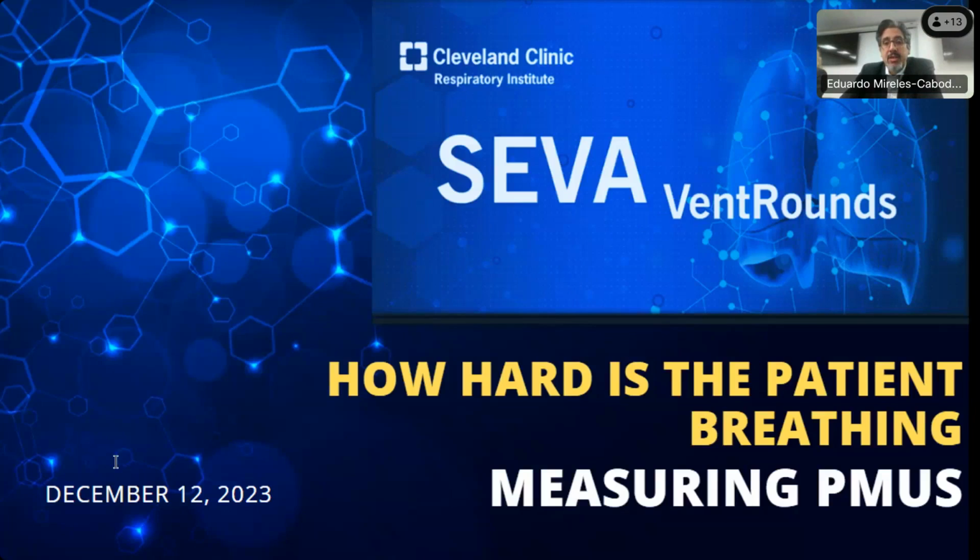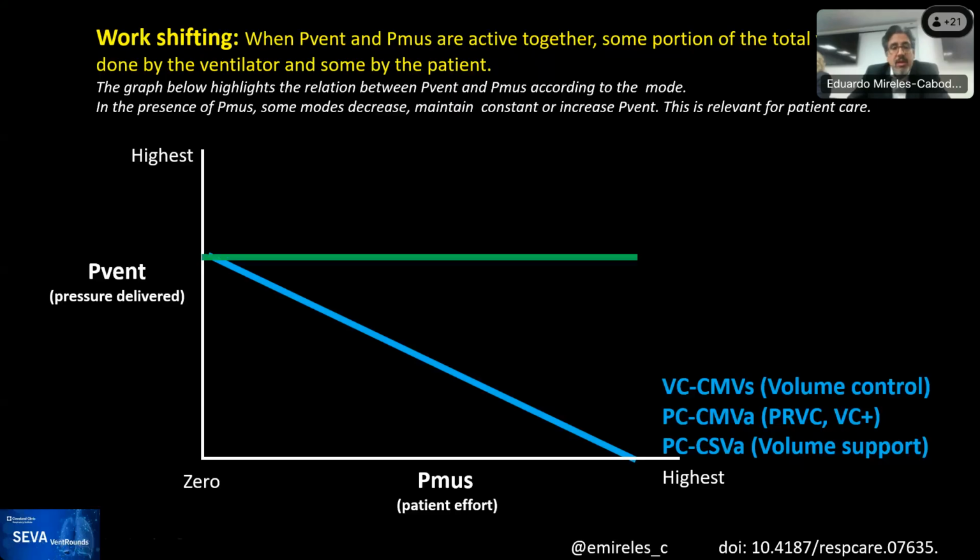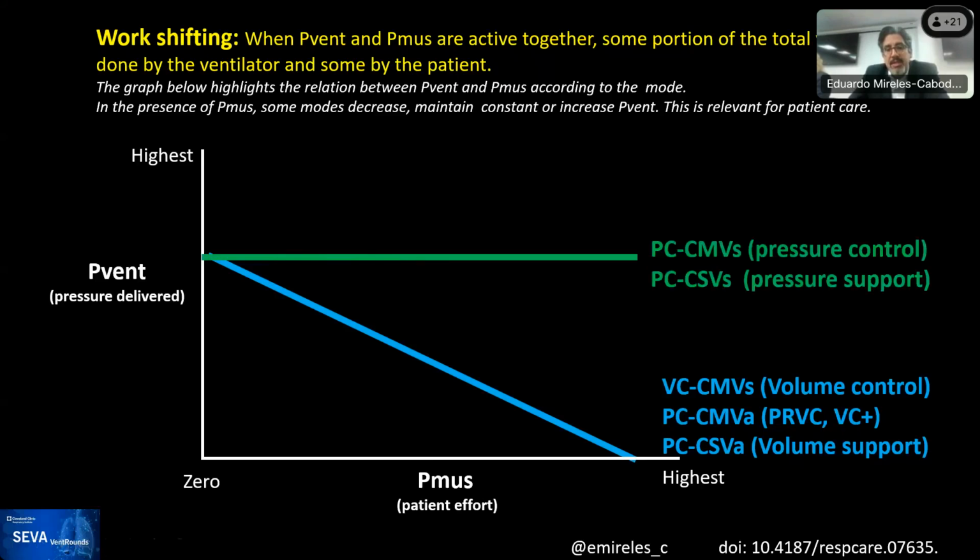Again, have no fear. This is where you test yourself. All righty. Excellent. So I see a large amount of our group is starting to recognize this as pressure control, and that's correct. This is a pressure control type of breath.